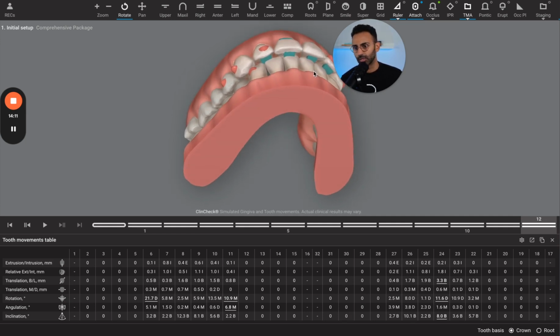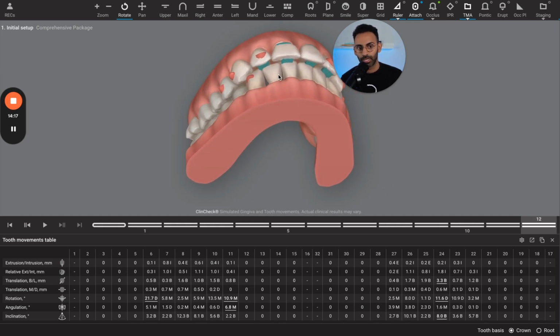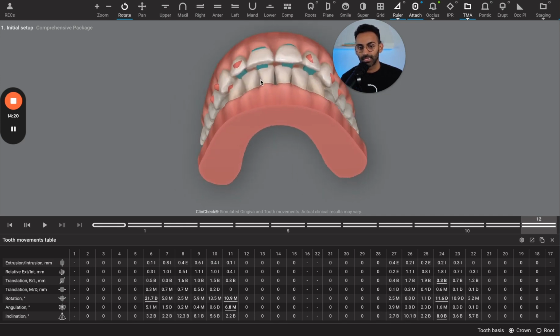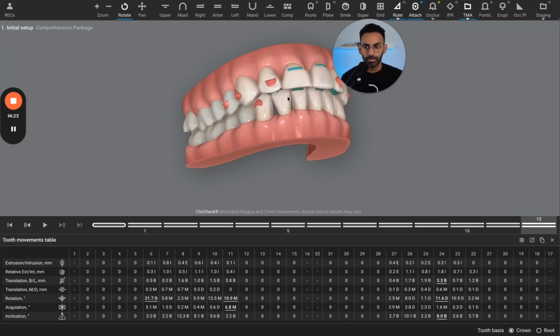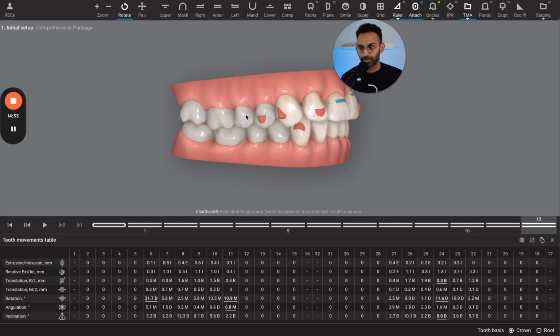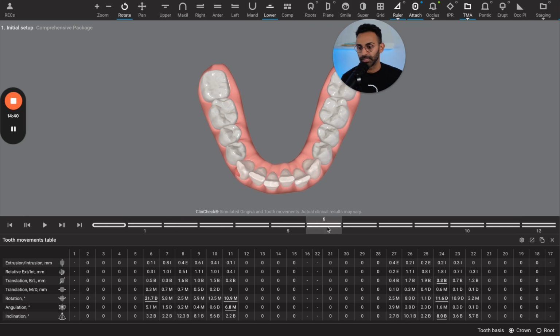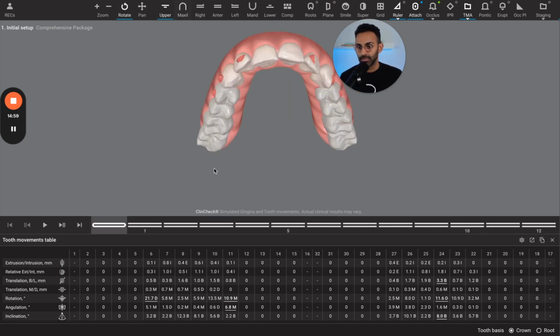Looking at the overjet and the overbite of every case and where you are finishing. And this one is finishing with 3.3 millimeters of overjet and 1.5 of overbite. So collectively, you've got 1.5 millimeters of interincisal clearance. So this case is going to be great. Yeah. So overall, I shared the modifications I would make on this case, adding some attachments that we don't have here just for anchorage. This case, to get this expansion, you're going to want your patients to be using some type of device to help stimulate that osteoclastic, osteoblastic activity, whether it's using the rubber part of the pull tool or a munchie. It's something that is getting those aligners to activate and stimulate that action.